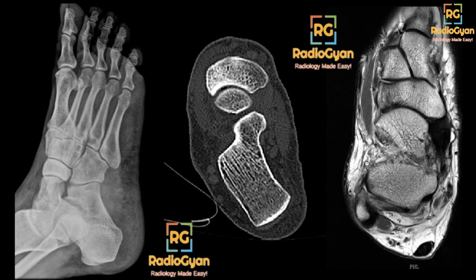A few of you have got it right. Marwa, you also pointed it out. Stuti, is this a pediatric patient or an adult patient? We discussed Köhler's disease, a very good case in our previous lecture. I'll leave a card to that in the corner so that you guys can check it out. I'll leave a card right here later so that those who are watching it and haven't seen the previous lecture can check it out.